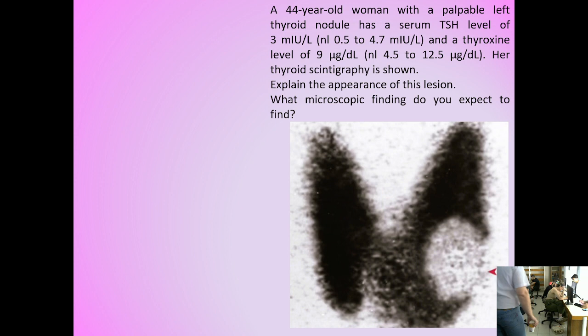This is not always related to cancer, but it raises suspicions that this nodule might be cancerous, especially if it is single, one only, and if it is solid, like this one. That means it is not cystic.